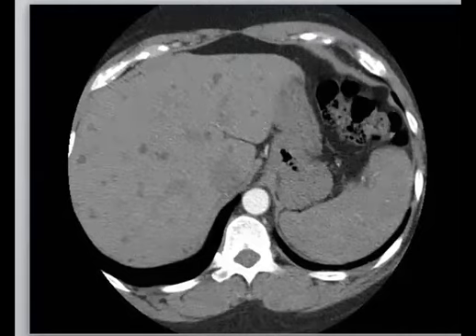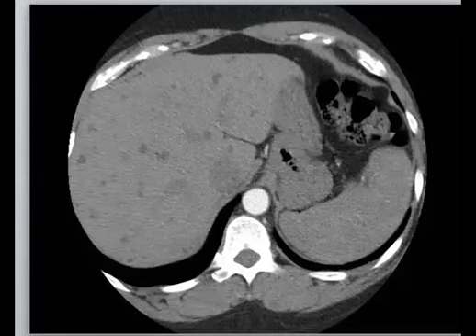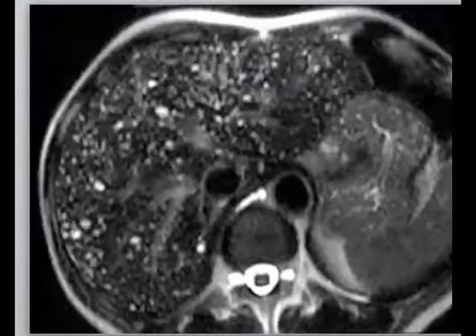So one of these will be candida. Okay, infection such as candida and other infection types. Yes, lymphoma. So this one, like what was told to us, would be biliary hamartomas, especially after you see the MRI, which has some characteristics with high T2 appearance.